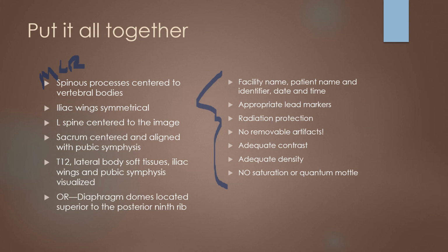They might be rotated. So make sure that you're treating that patient like they are one unit. Legs are extended, hips are parallel to the table, shoulders are parallel to the table, face is straight ahead. And making sure the ASIS are equidistant to the table is really going to help you master positioning of that mid-coronal plane.